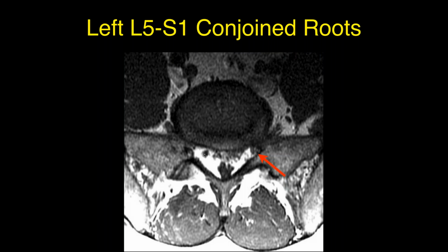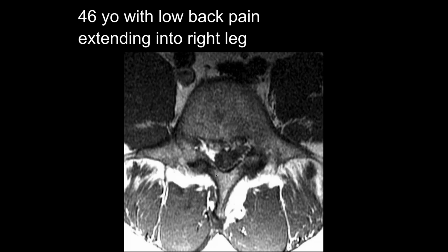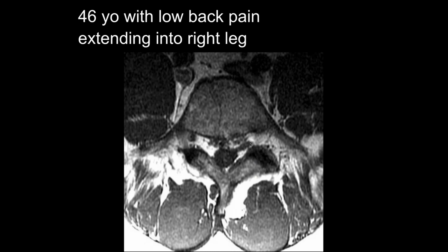So it's one common origin, basically, and they branch off? Well, they come down together, but they're adhesed, they stay together. Let's go back again here. So actually what's happening is the L5 and S1 roots are coming off together here. But the S1 root holds it medially, so the L5 root actually buds off more inferiorly on the abnormal side than on the normal side. If we go another cut down, on the normal side the root's really getting out in the foramen, but since this one is still connected to the S1 root, the S1 root keeps it from extending out until we get lower.